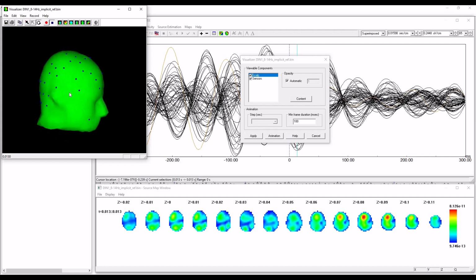And in addition, we have these two electrodes here down deep. That's good. In fact, if those are nice recordings there, we might want to use those as a reference. But they would also be picking up on some eye activity, these two as well. So we need to decide what to do with the reference.